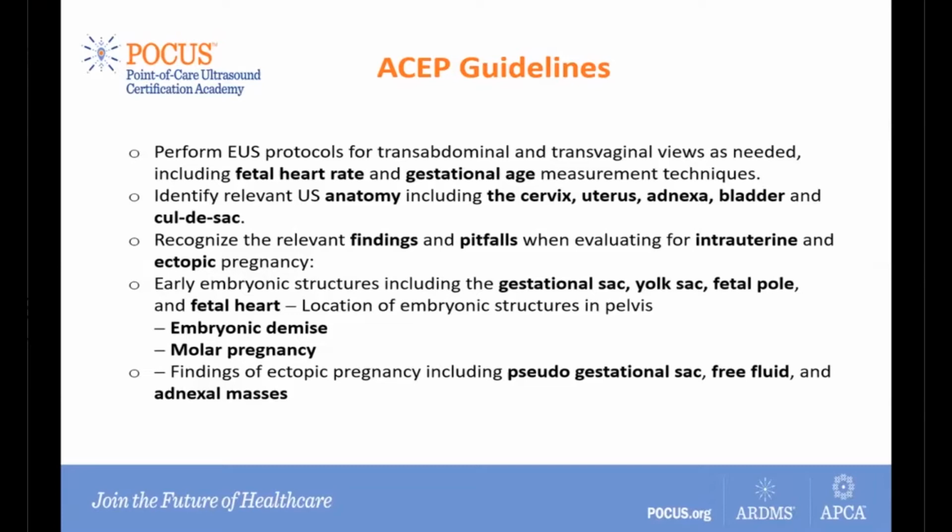In the event of embryonic demise, you should be able to diagnose that as well, in addition to a molar pregnancy and ectopic pregnancy findings such as pseudogestational sac and free fluid, or presenting as adnexal mass, or even adnexal masses that could be present when the patient is pregnant.